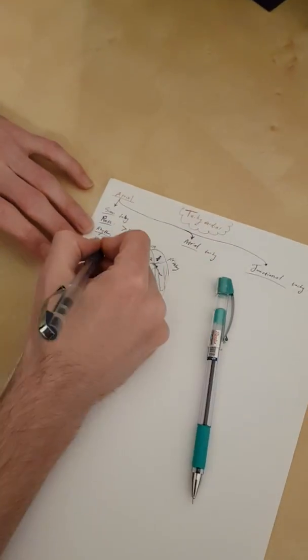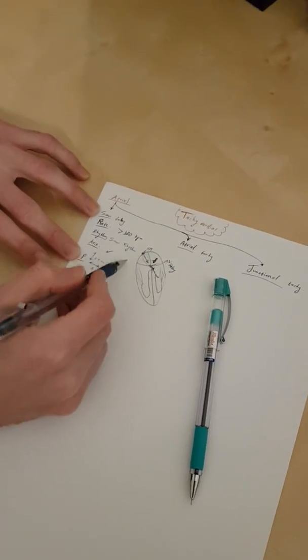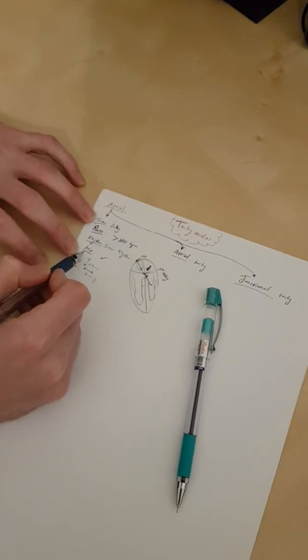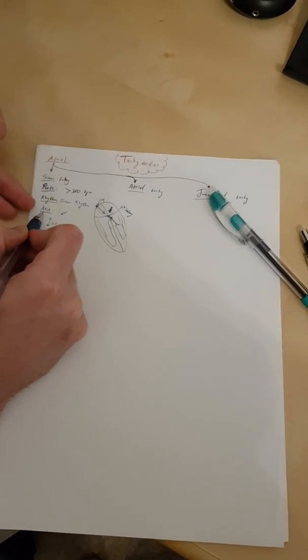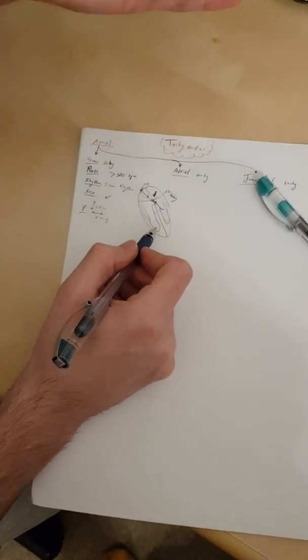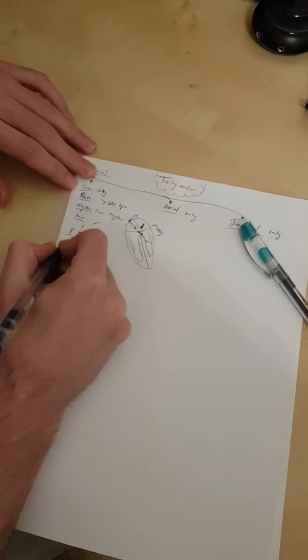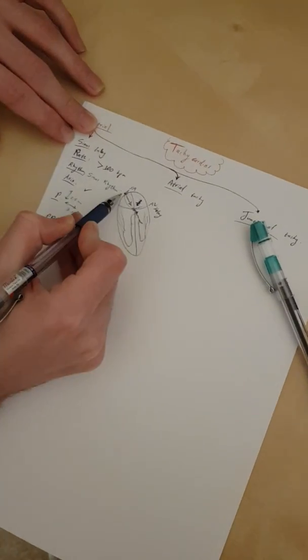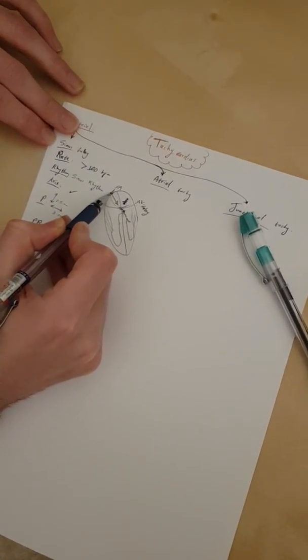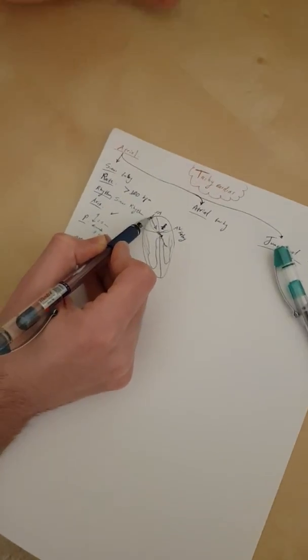Axis, it really doesn't matter. If there's a sinus tachycardia, then the axis is not actually a criteria. It can be like here, there, whatever. It doesn't matter. If it's different, of course, it might be another disease, but it's not necessarily something that has to do with sinus tachy. Okay, PR. So we said there's nothing wrong with the heart at all. It's only the SA node. It's hastened. It's giving impulses faster than the normal way.